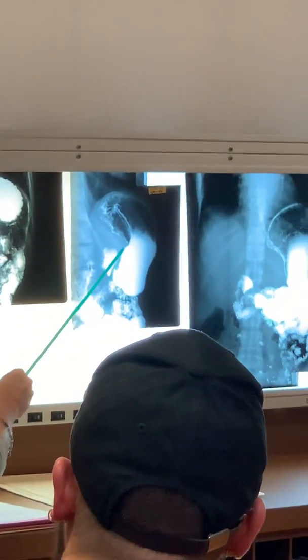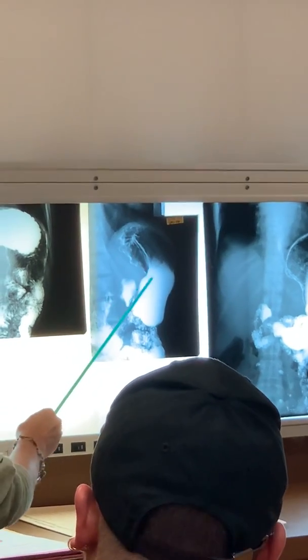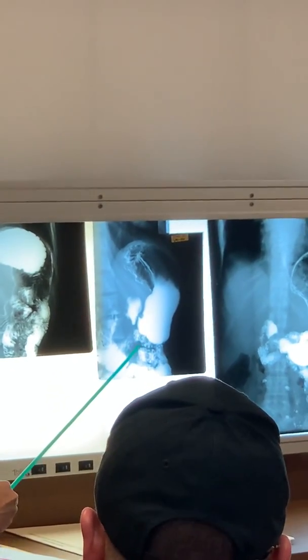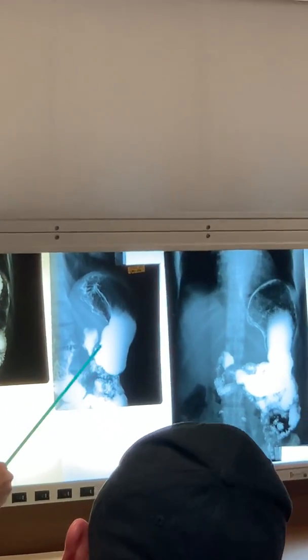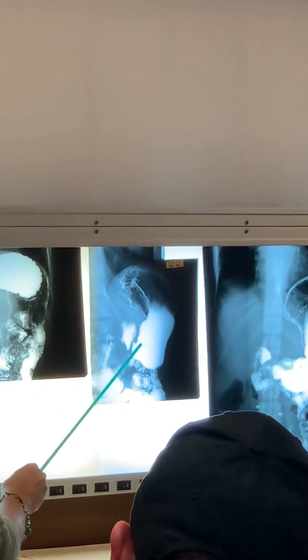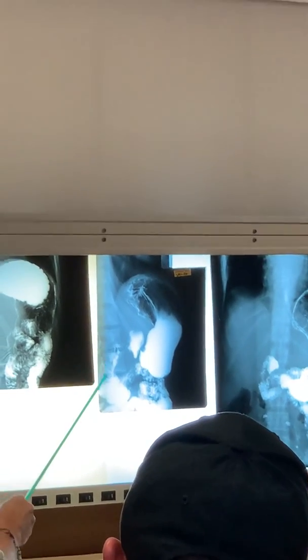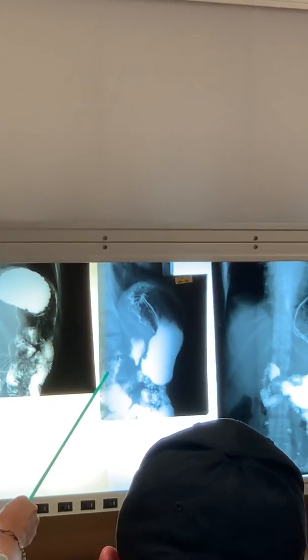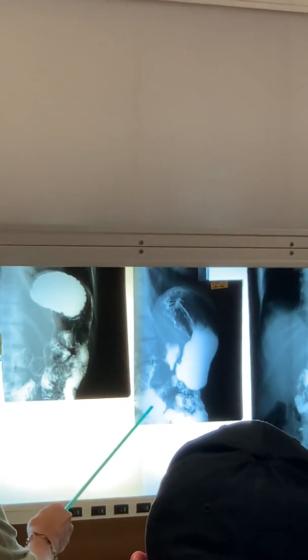What's the thing on the internal surface that allows fluid to go directly from the esophagus to the gastric canal? So this is the gastric canal, runs along here. What's this? Duodenum. What part of the duodenum? Yeah, this is the C loop of the duodenum.